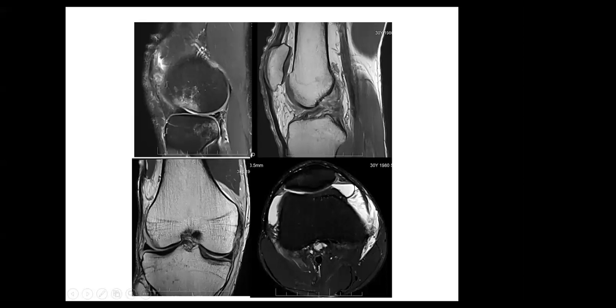I'm not really sure. This could be a plica, but could be a synovium as well. But anyway, you made very good observations, but sometimes we just need to fine tune your description so then you can make it a very accurate description of the injury or pathology.